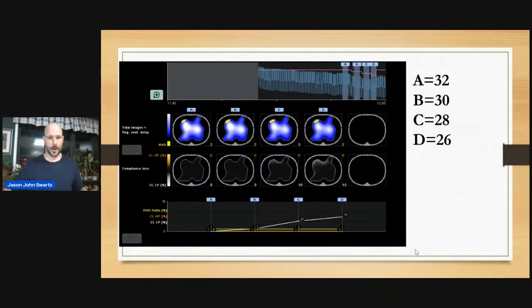We see here, these are additional. Remember I was saying you can do PEEP studies, but if you're using APRV, you can also do P high trials, and it works just as well. A, B, C, and D, various P high levels. Again, trying to get below 30 because that's protective.